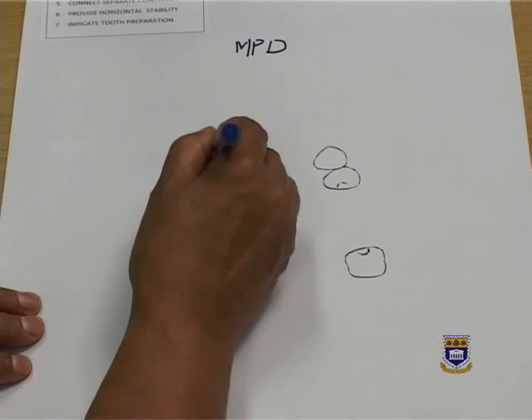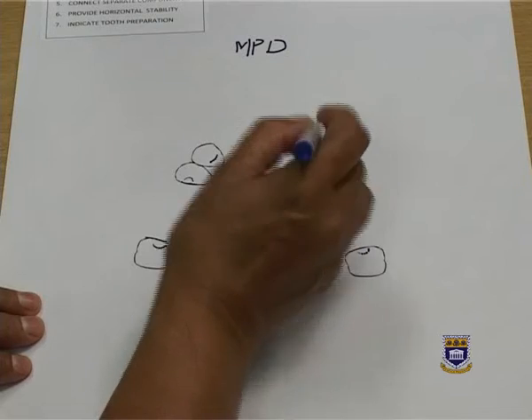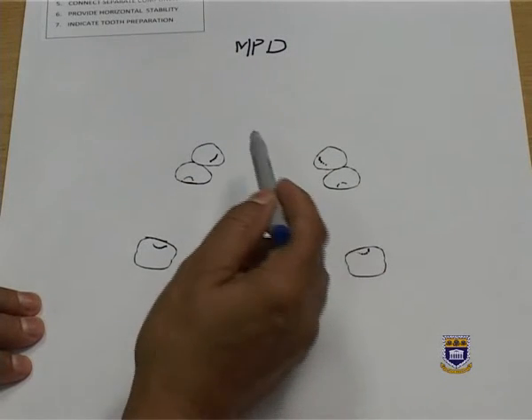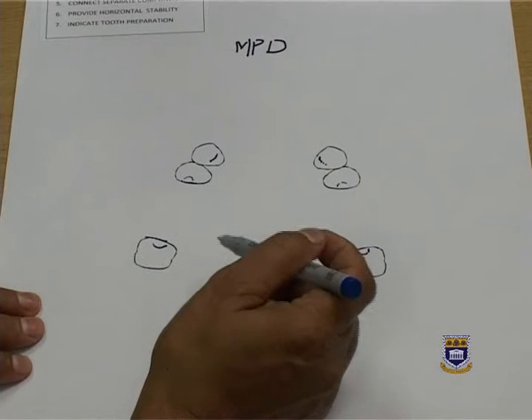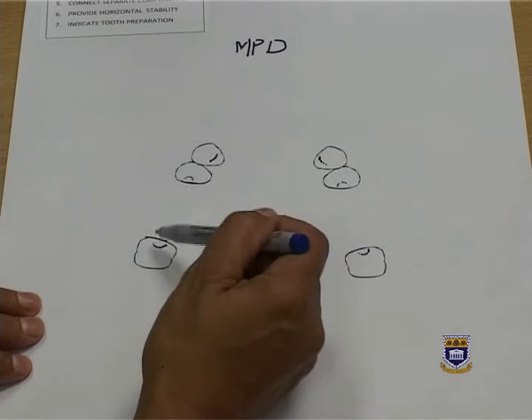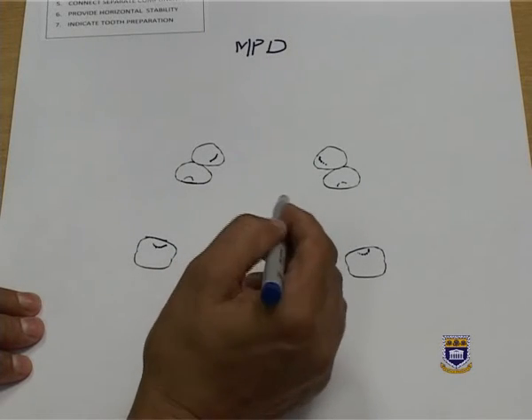I will also provide a cingulum rest on my canines, because each saddle must be supported so that the denture does not sink into the mucosa, because it must be a tooth-supported denture. Rests must always be provided on the abutment teeth, and abutment teeth are those immediately next to the saddle.